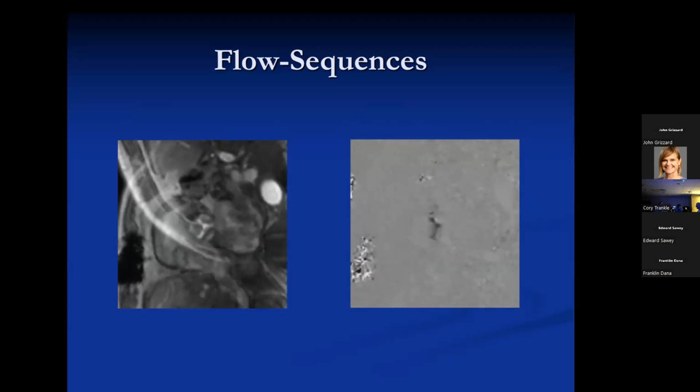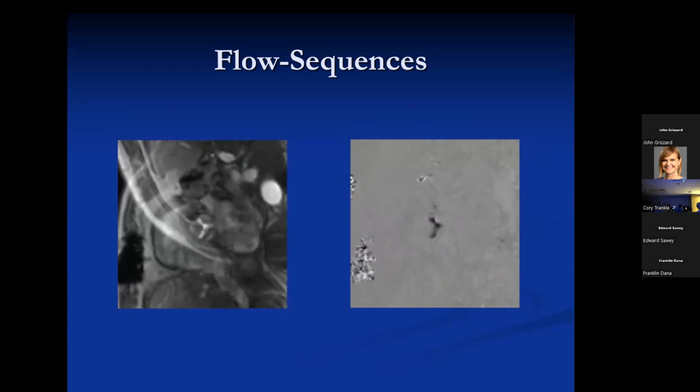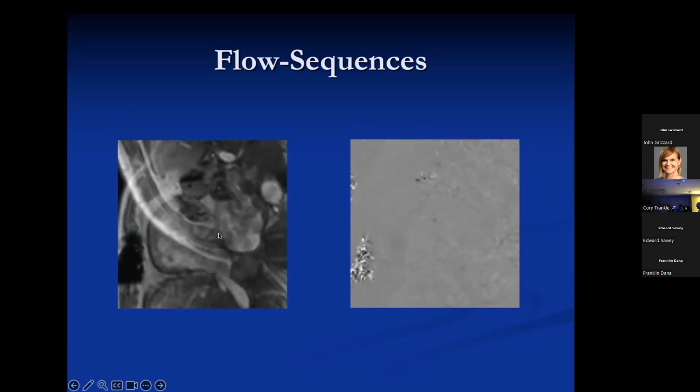One mistake I see people make with velocity encoded flow studies is they'll use a whole 380 field of view. You really shouldn't. You should cone it down so you get more pixels going through the area of suspected stenosis, and you get more counts that way. And if you have wrap along the periphery of the image, you don't care about the wrap. But in this instance, it wrapped right into the pixel, so that's not ideal.